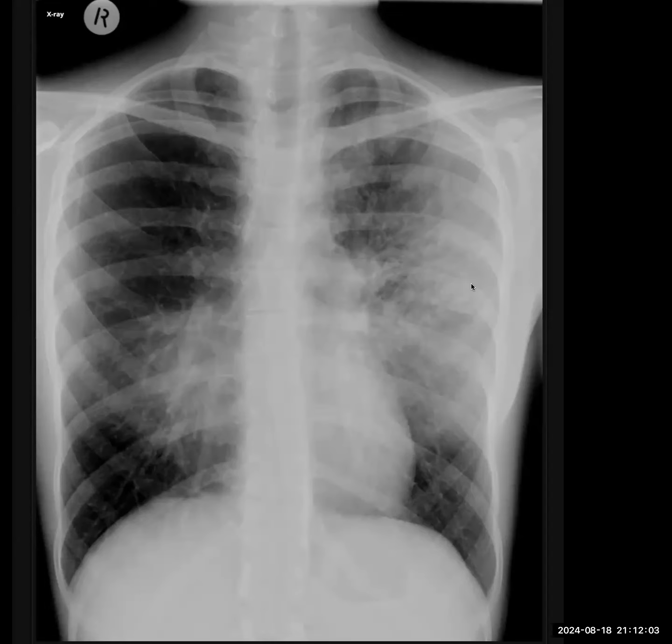The left lung field shows a very large area of veil opacity involving the upper and mid zones. The bilateral CP angles appear spared. There is also an opacity seen in the right mid zone. I can't quite see the right heart border well. Other than that, there is also obscuration of the left heart border in the upper part. So I'm suspecting infective etiology in this patient.